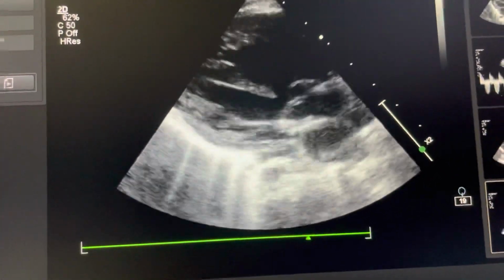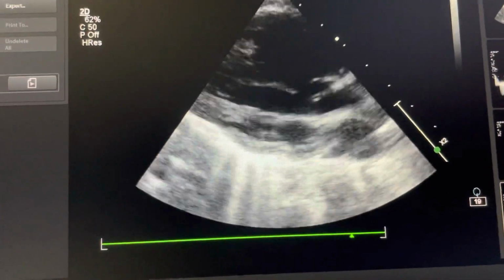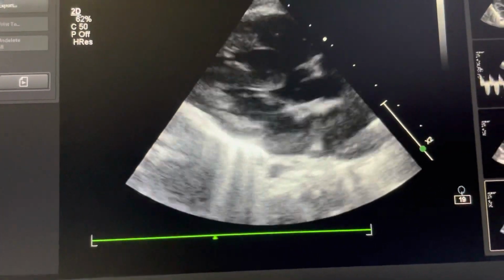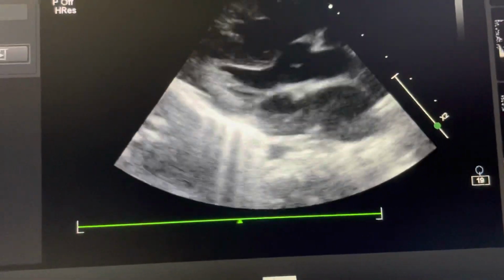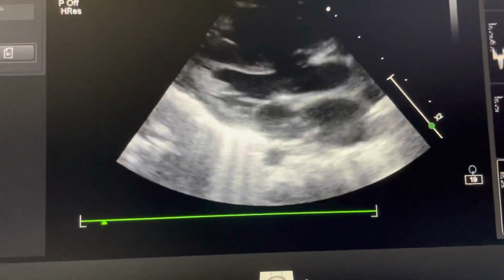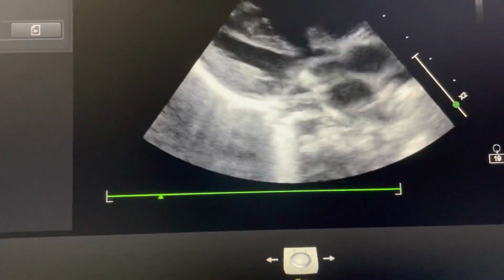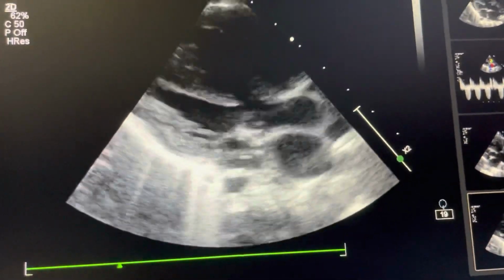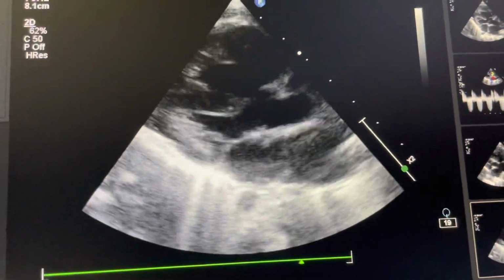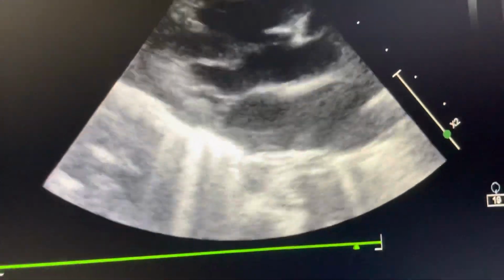In this image you see left atrium, left ventricle, aorta, right ventricle, subaortic VSD, and hugely enlarged right pulmonary artery. Any tubular structure that is seen in cross section behind the ascending aorta, that is the right pulmonary artery. So the right pulmonary artery is hugely enlarged in this image. You can really appreciate it.